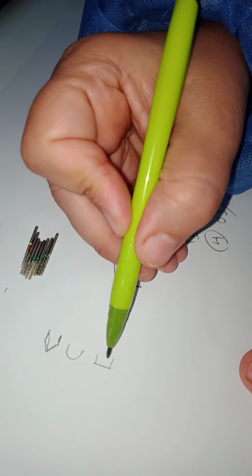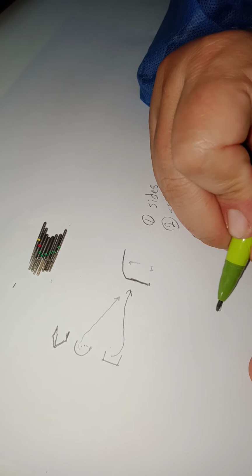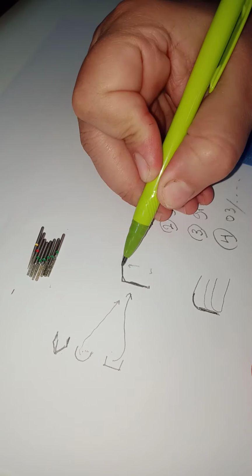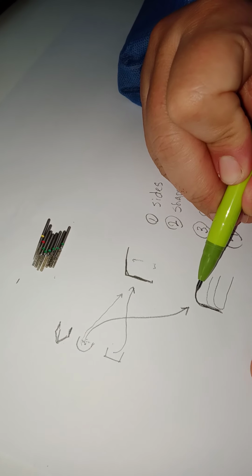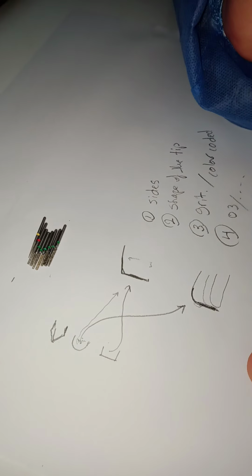Now, when I want to create a shoulder, we use the shoulder-shaped tip. But can I create a shoulder using this? Yes, I can. Suppose this is the tooth surface, I come in with a round bur and go deeper. I'll get this shoulder, and I'll get it rounded. It's not a sharp angle, but rounded. So the round bur produces a shoulder, then a rounded area. But there is a risk that it might go deeper here and you create a ledge. There should not be any ledges lateral to the axial wall, okay?